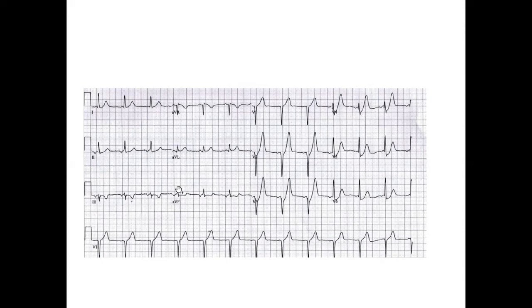So you may sometimes get a doubt whether it is STEMI or not. Actually, if a patient has classical symptoms and you find this type of ECG, you should consider this as ST elevation MI and you should treat accordingly. You have to go for reperfusion, either by primary percutaneous coronary intervention, or you may have to go for fibrinolysis if a PCI setting is not available.